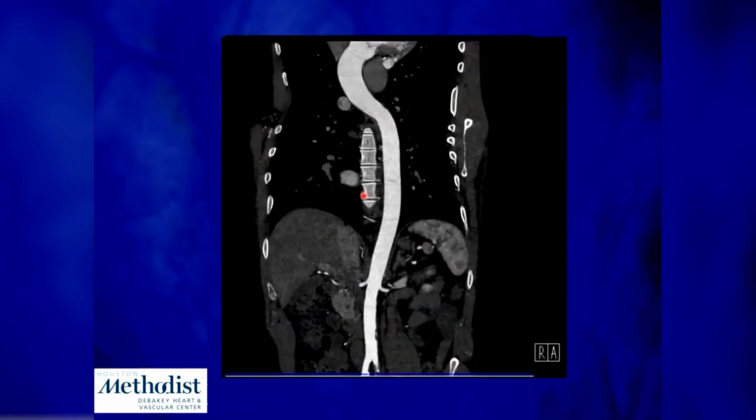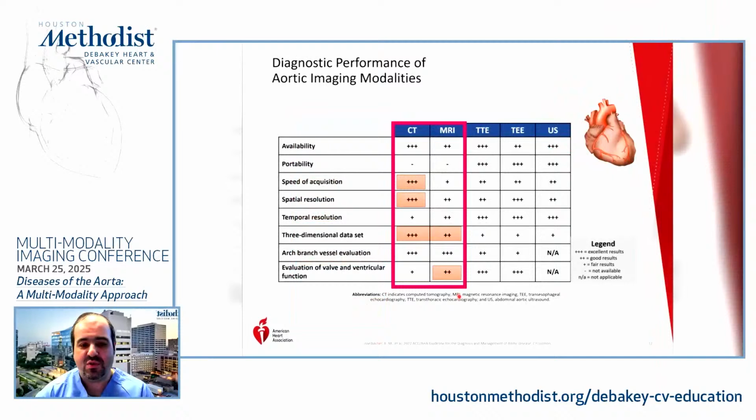and abdominal aorta branches. And this is a reconstruction from a CT curved planar reformat showing you the aortic valve all the way down to the distal abdominal aorta. And you could even appreciate a very minimal amount of plaque and calcium that could be present in those segments.